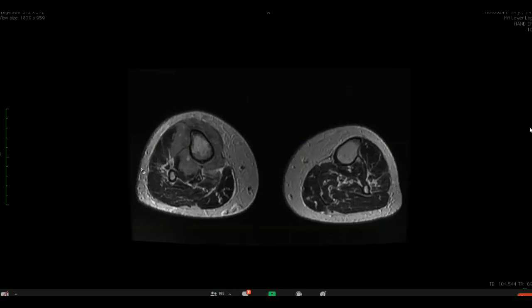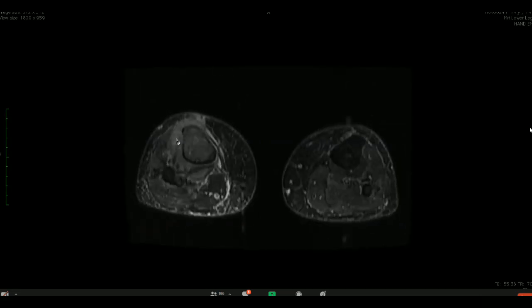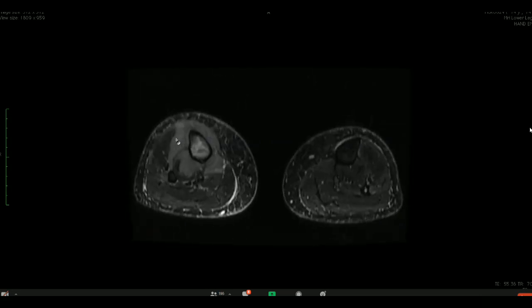Very good. If I was to ask you one of those two, which one would it be? Sir, it must be most likely some metastatic disease. In this case, it would be more likely lymphoma, and I'll explain why.